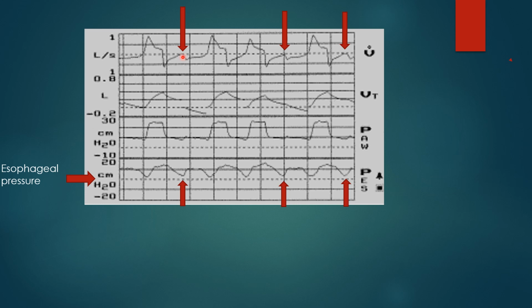Patients with COPD often have a lot of air trapping, and another type of patient that will frequently be seen doing these missed triggers is a patient with a high level of pressure support. If the patient is trying to breathe 30 times a minute and we increase his pressure support to try to get more tidal volume, we're going to force a longer spontaneous inspiratory time on him because the pressure is going to be higher. And that will decrease his expiratory time. If he continues trying to breathe 30 breaths per minute, he will have these type of missed triggers. He will be having air trapping, auto-PEEP, dynamic hyperinflation, goes by a lot of names.